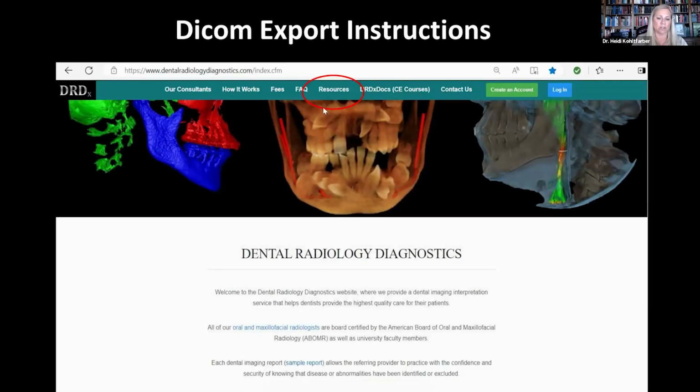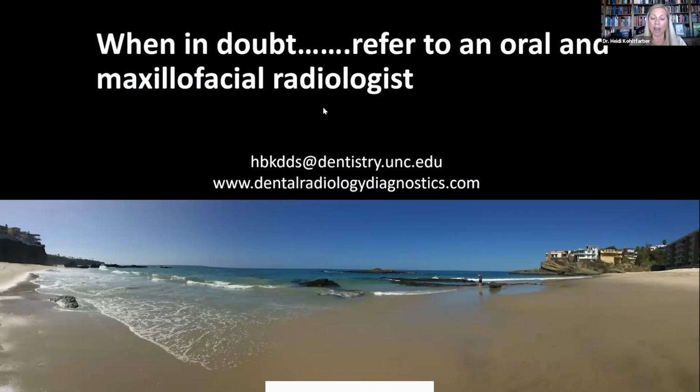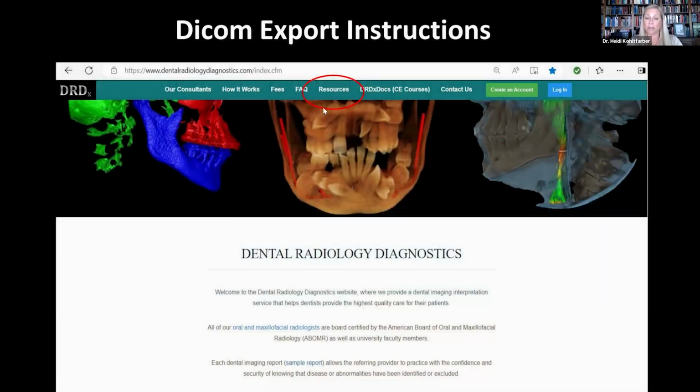And again, we do have resources. So if you need to export out, say, a DICOM file or anything like that from any different machine, we have it under our resources section. So you can figure out how to send a volume to a specialist. Because, of course, we want the actual DICOM files. We don't want the viewer. So that is a distinction, because we all have our own 3D imaging software. And for some of the imaging companies, we actually have a plugin. So if you go to our website, you can install a plugin that will automatically go into your output section. It'll already say DRDX. You would just have to push that, and that would export out your volume automatically into our secure servers for us to review your scan.